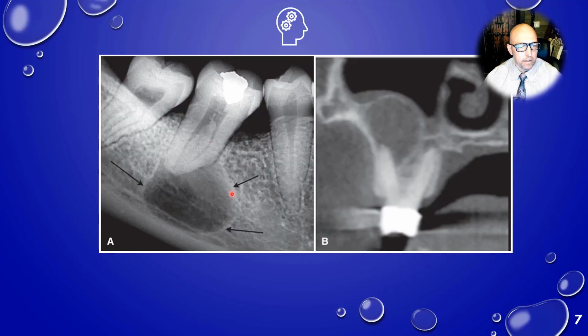We've shown you this in the common periodontal lesions lecture. This very sac-like, cyst-like lesion. This is a periapical cyst, and another one just in a coronal view.